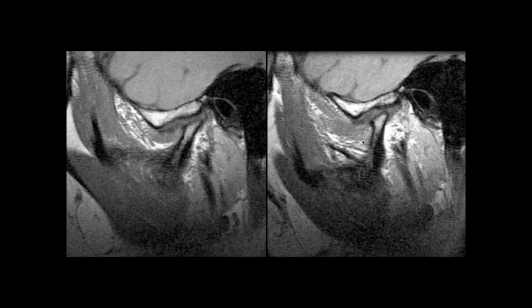Tom, let's see. No, Sahar, what do you think of this one? Okay, yeah, I think this does exist, but it looks maybe a little bit degenerated. There's some increased signal. And the condyle is kind of anteriorly displaced on the first image. What, the condyle is anteriorly displaced? This is posterior. This is posteriorly.